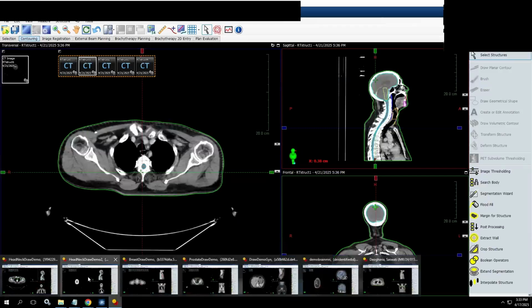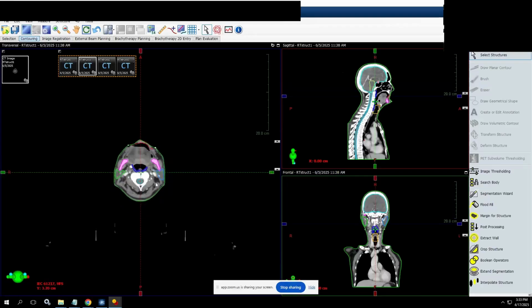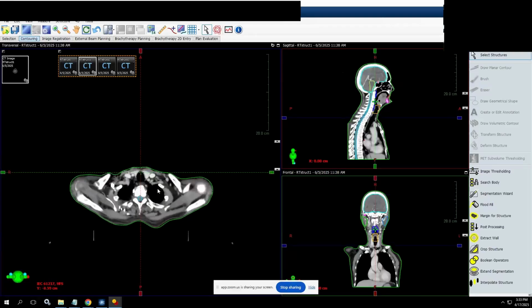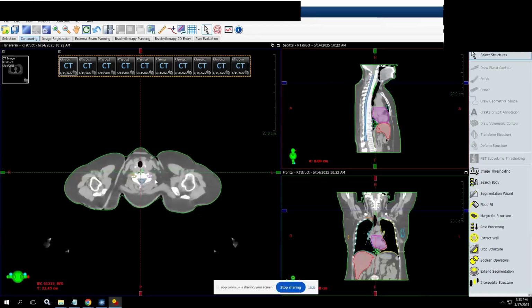In the next case we will see the performance of the model in a thinner patient. This patient we have selected particularly because the body mass index is quite low, and this has been a problem when we evaluated segmentation solutions generated from the West, where models were trained on more obese patients. And we can see that because our training dataset was representative of the Indian population, we got a reasonable model performance even for this patient. In fact, all the structures have been drawn.